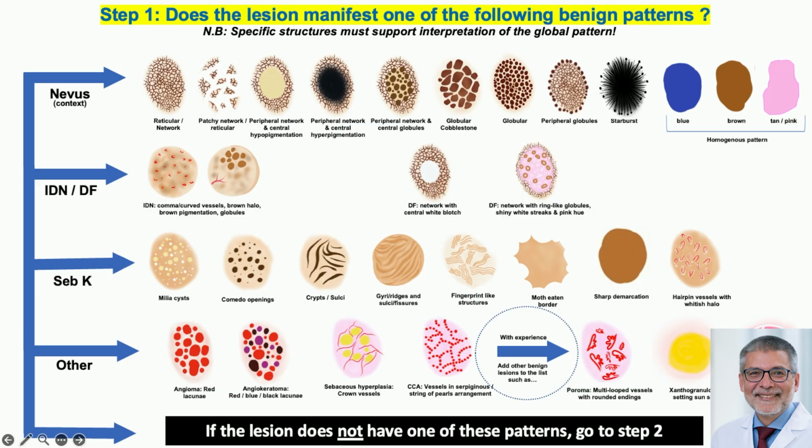Now, there is another group of benign lesions. I will highlight them, but I'm going to put the caveat that for all of these, we do recommend they get biopsied. It is just for you to submit to the pathologist that I think this is what it is, but you need histologic confirmation that that is indeed what it is.